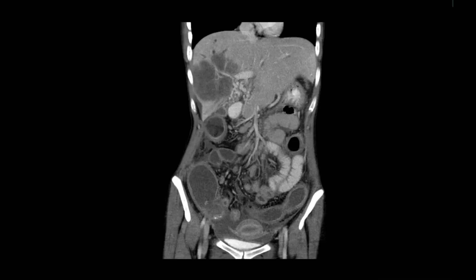This is inflammatory bowel disease with abscesses in the liver. You start right and then you deviate.